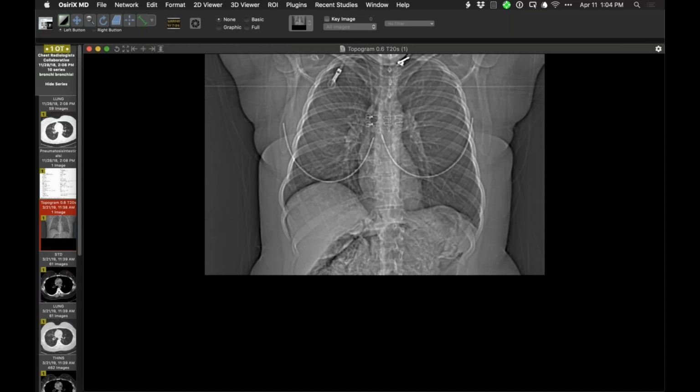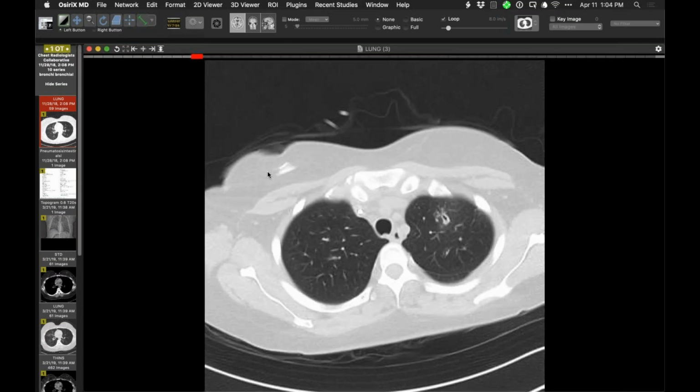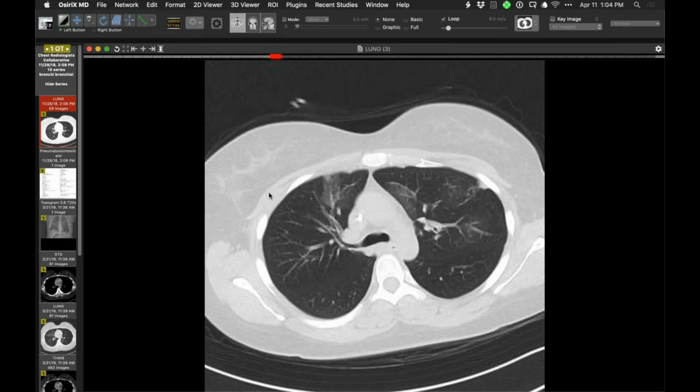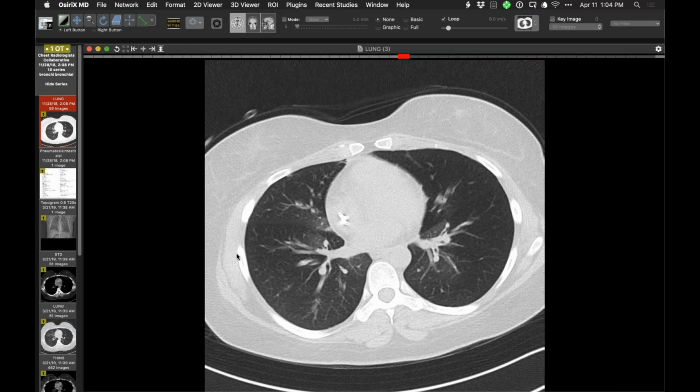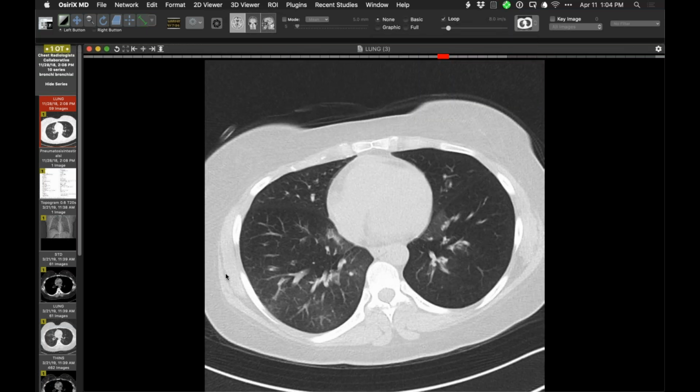The clinical context is a patient that had allogeneic stem cell transplantation quite some time ago for, I'm afraid I can't remember what, and I'm not entirely sure why this chest CT was done. So I'll show you first the lungs, which has the dominant finding, which is very typical of constrictive bronchiolitis in that context.